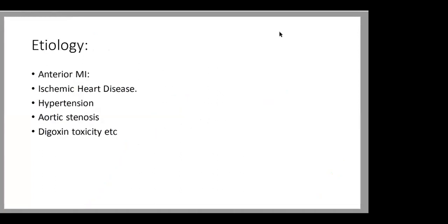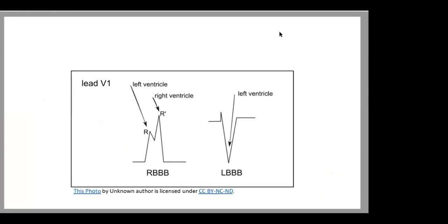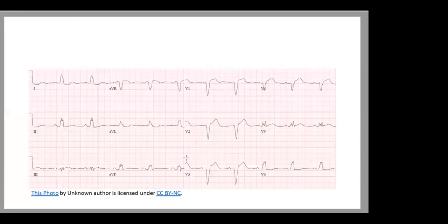We skip this one again. And we skip that one again. We'll come back to it. We skip it. Okay, skip it again. I don't know if I got an ECG on this.